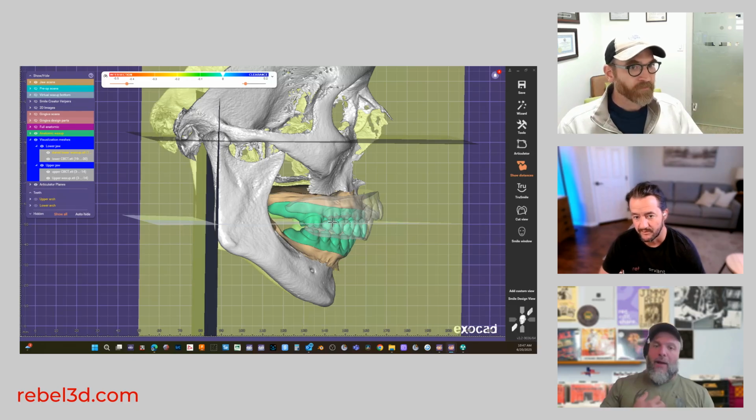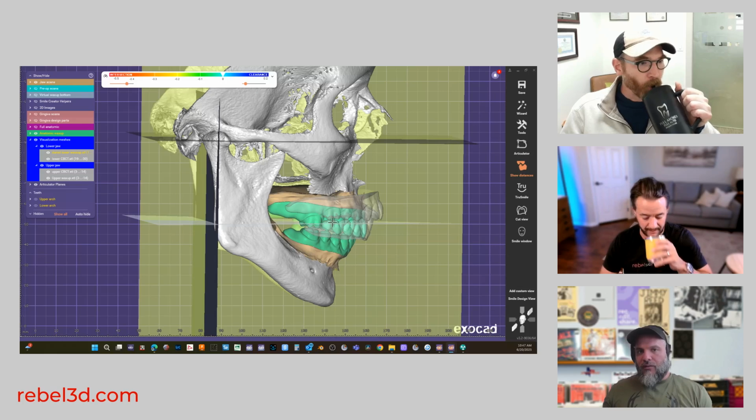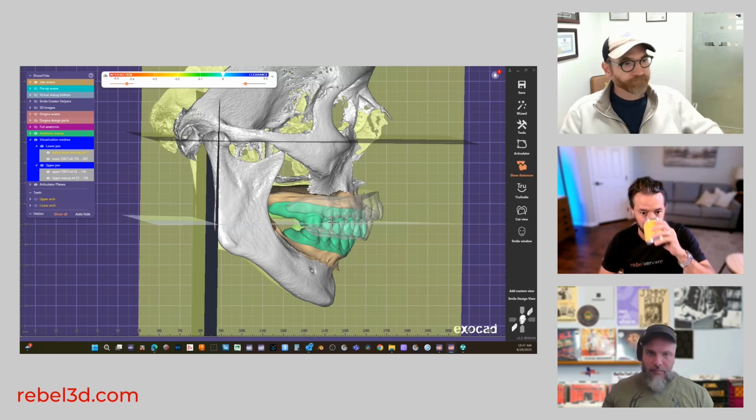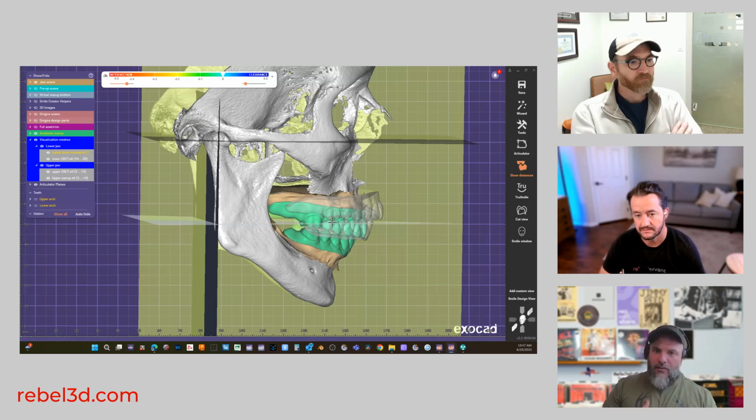And then from my end, I will say, always use a leaf gauge. Yeah, always. It is much more reliable than what I'm going to be able to guess. 100%. So let's do that.